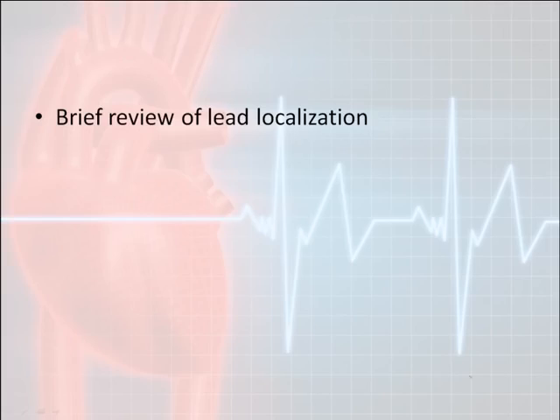We're going to discuss lead localization now. You have to understand the lead localization with the ST segment elevation to know where this is occurring in the heart. I did cover this quite extensively in my first presentation, the introduction to the EKG, where I talked about what each lead looks at. That's a great review if you need to. This is just going to be a real short, sweet review of what each lead looks at.